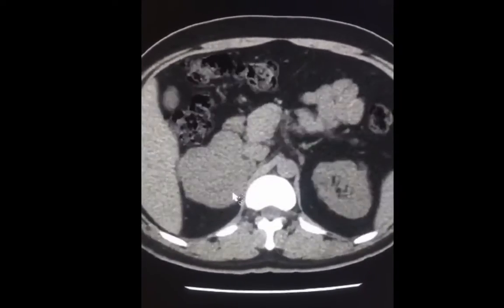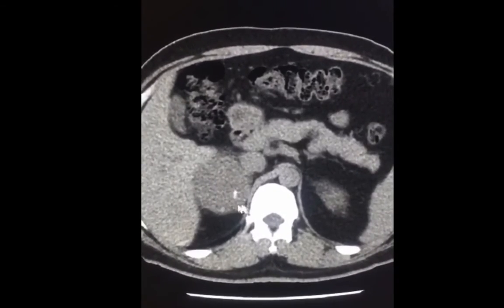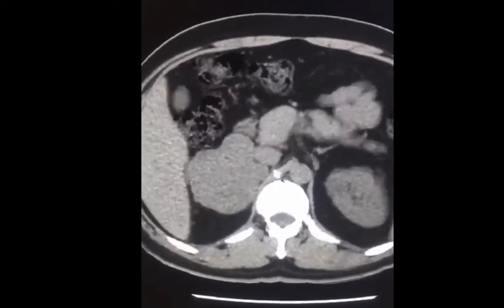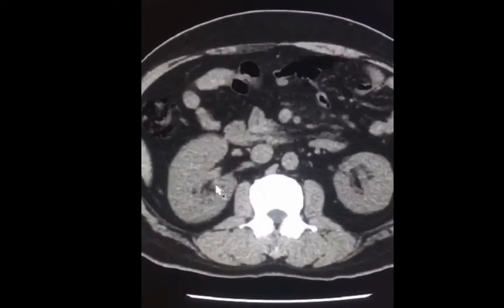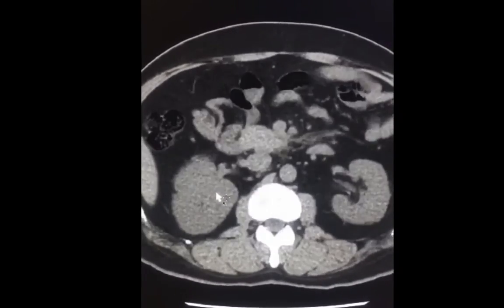There's a large lesion in the right suprarenal fossa showing foci of small calcifications. The abnormality displaces the kidney inferiorly. At this point, the lesion could be arising from the adrenal gland or from the kidney itself.